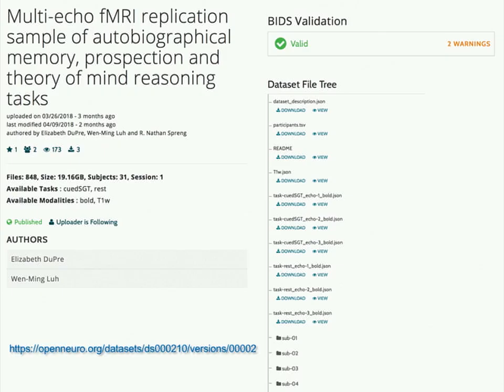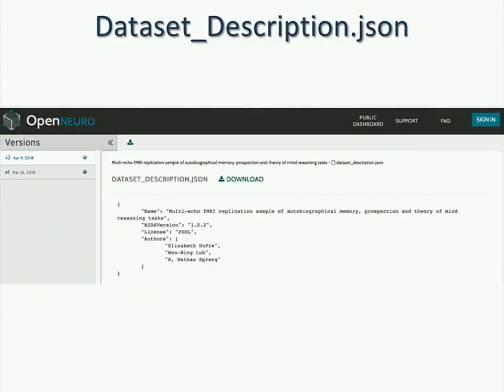that contain the information for the various subjects. And in the BIDS spec, there is a whole listing of how that directory structure gets created. One of the core files is this dataset_description.json. And this has basic information about the data set.